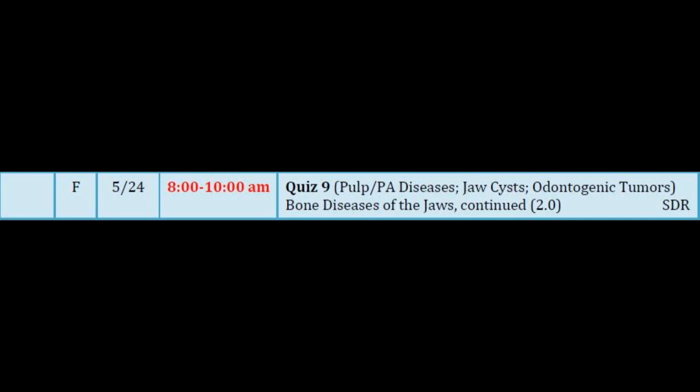How would you describe it? Lucent, opaque, or mixed? Mixed. Is it corticated or non-corticated? Not corticated. Aha.